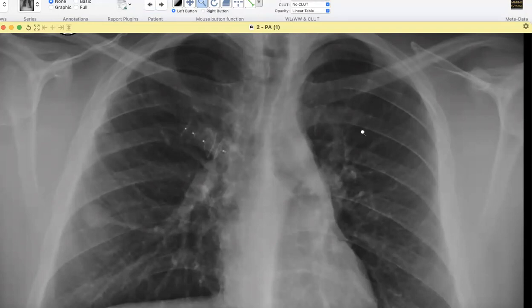You're asking me about this artifact, or as a whole? Yeah, put together, like, what can we think has happened before? So considering the appearance of the other lesion, the patient might be a case of hereditary hemorrhagic telangiectasia, and this might be treated or embolized other AV malformation previously in the past.